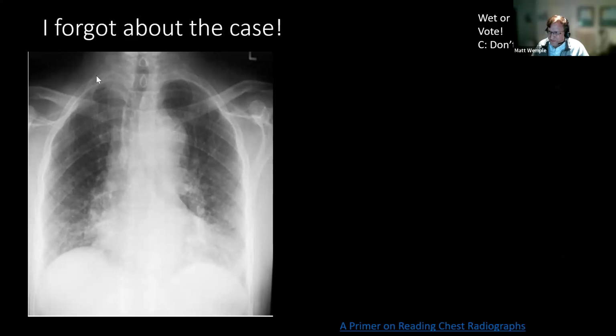So the first rib is going this way. The second rib is here. Can you guys see my cursor, right? We do see your cursor. Okay, awesome. So third, fourth, fifth, sixth, seventh, eighth.